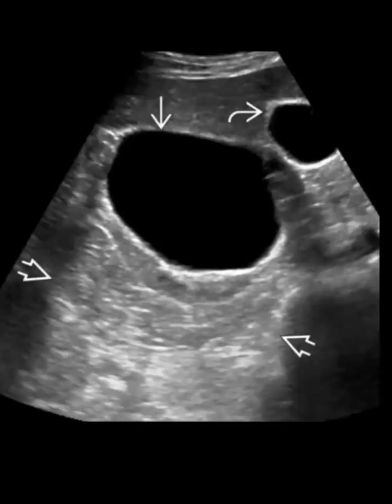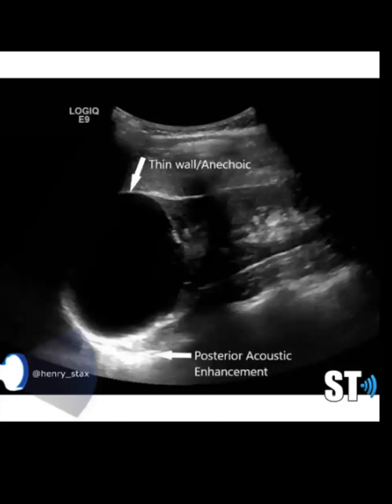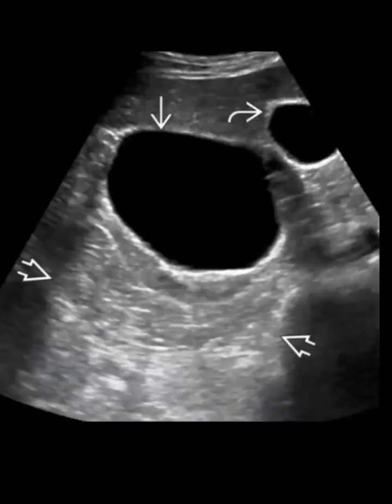Yes. So what is the diagnosis here? Huh? What is the diagnosis here? It is a simple renal cyst. Okay. It is not a complete picture, but here you can see clearly. Yes, that's very clear. Okay. So anybody can tell me the Bosniak classification of renal cyst?